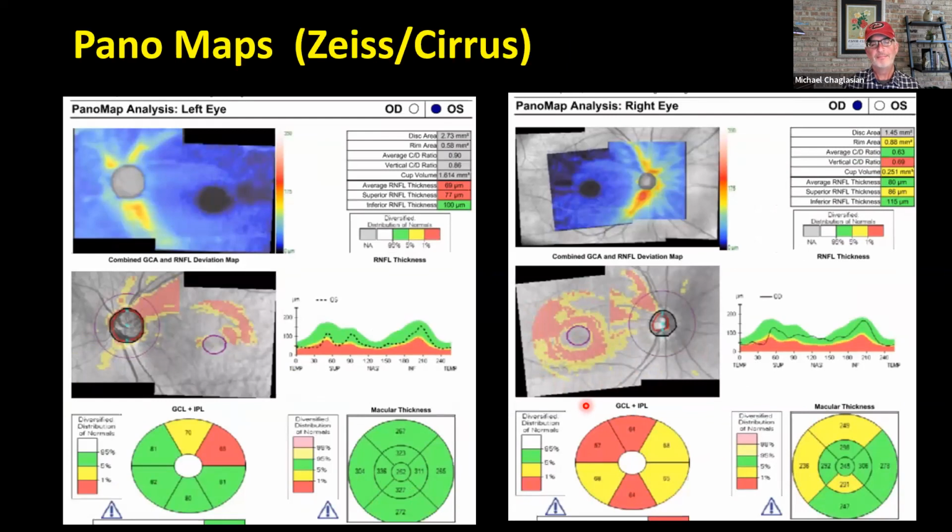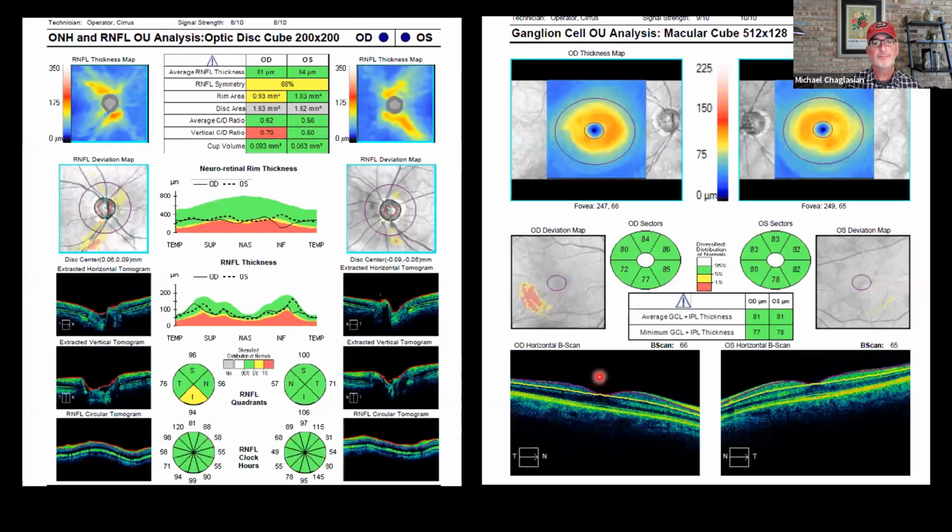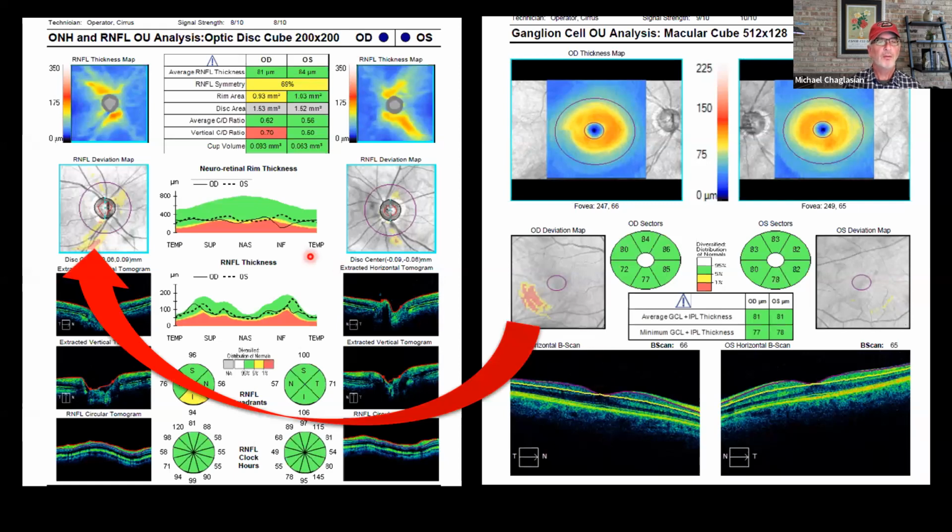Yeah. And you may look at the macula. A lot of these patients, I don't always see disease. It's variability within the reference database. Reference databases are not perfect. Here's some, very early, I think this is the case that we saw earlier, and I don't know where the panel map is for this one, but that's what we're talking about tying together.